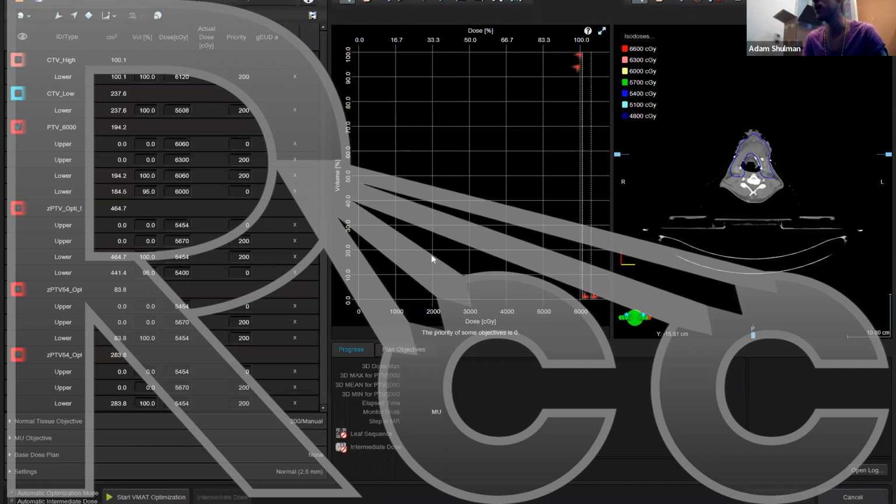Okay, the principles of contours, that's the same for every planning system. And then how I'm going to optimize should be very similar for any planning system, just because we're looking at slowly massaging the dose in the large MLC motions. And then once those are set, fine-tuning the MLCs. The concept is similar no matter what the treatment planning system. So focus on the concepts more than just the keystrokes that I'm doing.